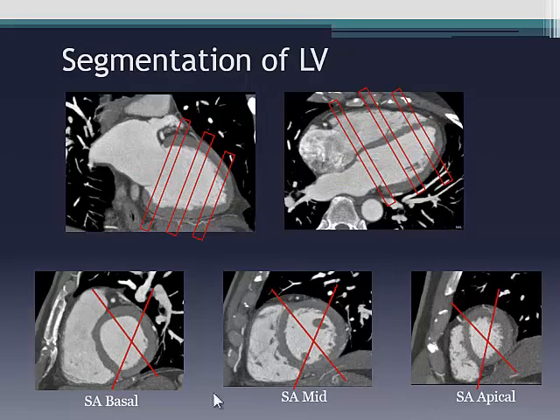So here. So what we've done is at the basal level and the mid-ventricular level, because there's more tissue, we can actually further subdivide these segments. But basically what you've got is your anterior and inferior walls on all the various bits. Then you've got the lateral wall, and then you've got the septum, okay? And then because we're higher up and you've got more muscle, you can cut that in half. And then you've got the anteroseptum, you've got the inferoseptum, you've got the inferolateral wall, which confusingly can be called the posterior wall. So a lot of your cardiology colleagues will say, show me the posterior wall, and that's what they mean. And also the anterolateral wall, okay?